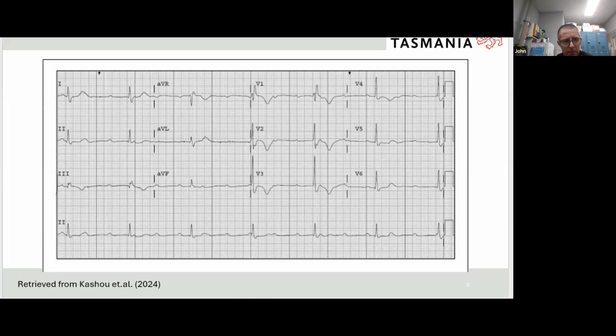Is that reasonable? Yeah, so ideally you can mark it, to explain what John is talking about. It's a good way to pick up patterns. You're right, John. Yes, you can mark it and slide it along. I'm in front of the screen and I've mapped them out and the P waves are at 100 beats per minute, and the QRS complexes are at 38.5. So there's dissociation, but you can see where they should be by sliding. That's the other thing. You can find the pattern for the P wave because there's an atrial rate here and a ventricular rate.